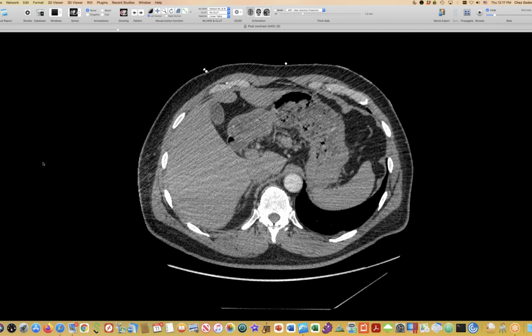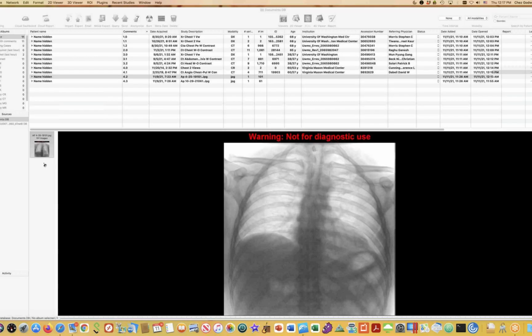They said that on the table, observing him fluoroscopically, his right hemidiaphragm recovered some. It went to a lower position, so he recovered some volume on that side, and he felt better right after the surgery. So let me show you sniff tests before and after.